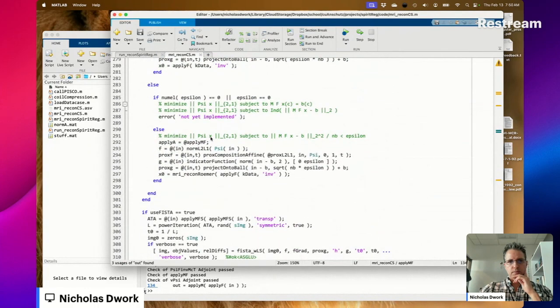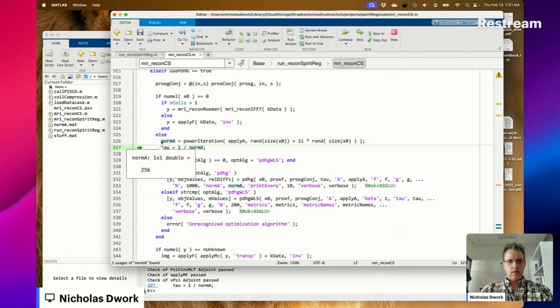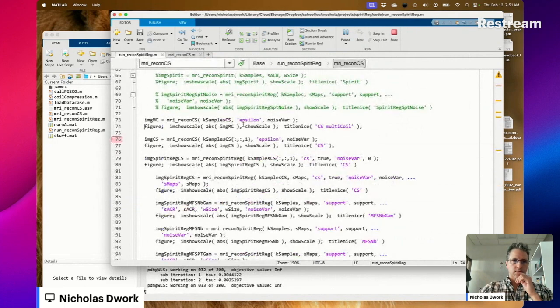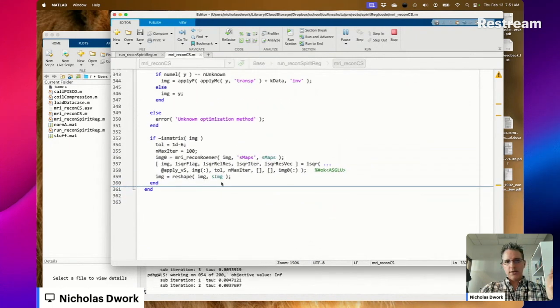Here, X are the images of all coils. Got a lot slower now because we're working with multi-coil data. We're at a sample fraction of 60% still, so each coil should look good.